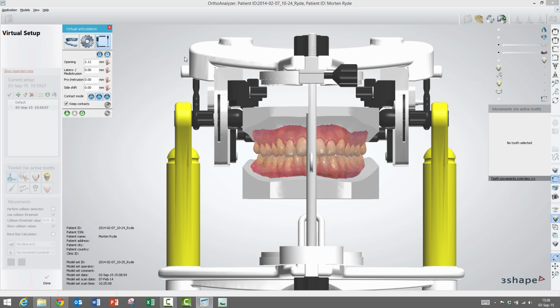That's a good tip. Then a right click on the pin, and you see I have show incisor pin, so that can be deactivated or activated. And this time I have to click on the top of the articulator to get the same message and reactivate.